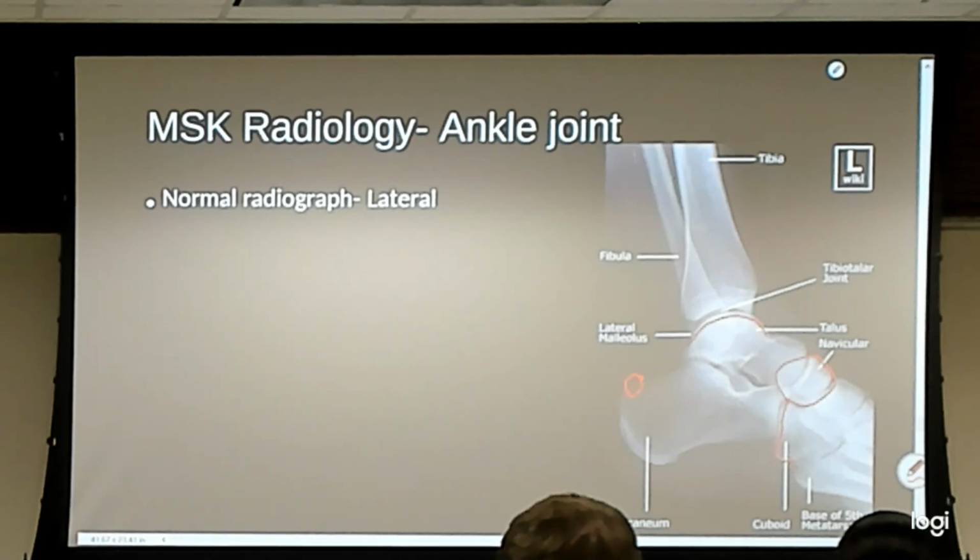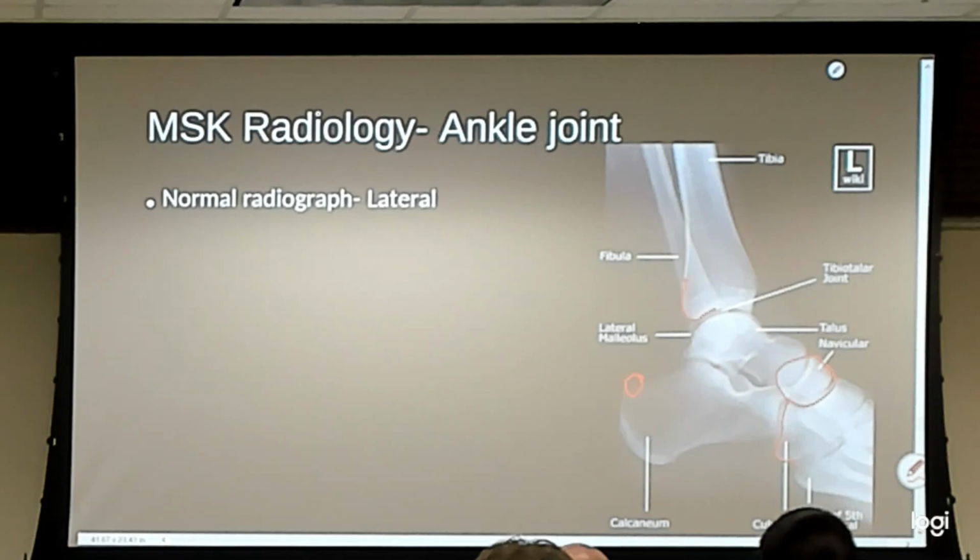Is there a chance you could point out the posterior malleolus on that? So the most obvious section of it is this part right here. There is more to it, but that's the obvious part of it. There's a lip of it that catches, but you can't appreciate it here because you're stuck on that bold line there, right there. Anything else? Anything I need to outline again?